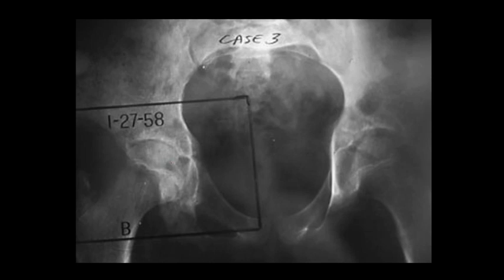We're getting some osteolytic destruction, so we've got kind of some circles. There's some areas of destruction in here. So we've lost that subchondral white line up there. And again, joint space is destroyed. So that was 26 days.